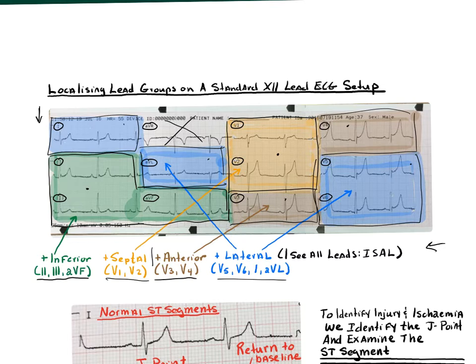That just is mind-blowing to me, that we're able to look at it that way, and we're able to tell what coronary arteries are perfusing these areas. Now I begin to realize I can localize where problems are occurring in the heart based on changes that occur within the PQRST complexes of these leads.